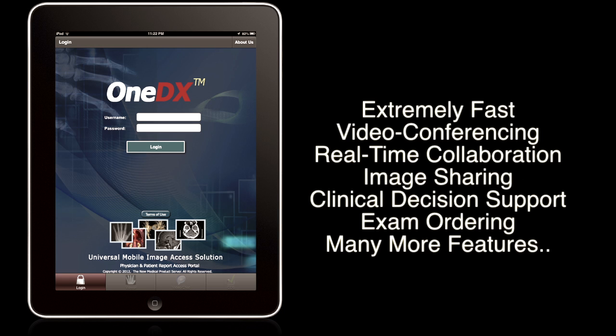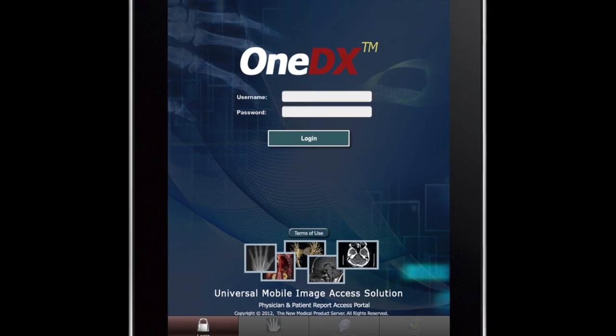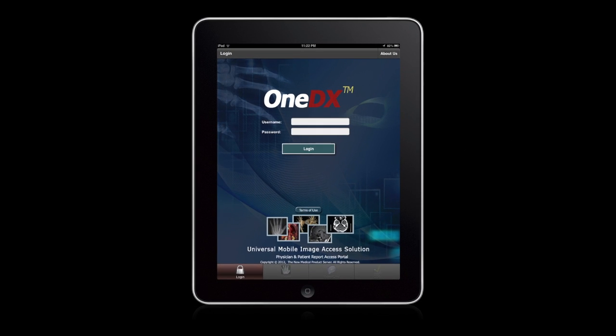The OneDX mobile application is a medical imaging mobile application, very, very powerful. We don't think anything can compare to it at the moment on the market. Let's take you through it and show you what makes this application very, very unique.